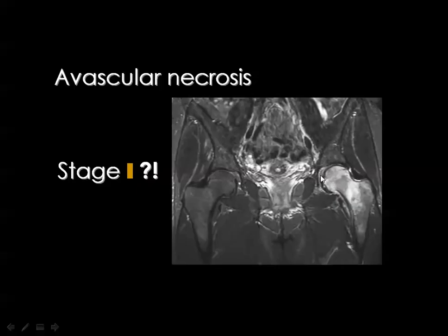Since this bone marrow edema may be diagnosed as migratory osteoporosis of the hip, and this migratory osteoporosis, as I will mention, is a self-limiting disease.